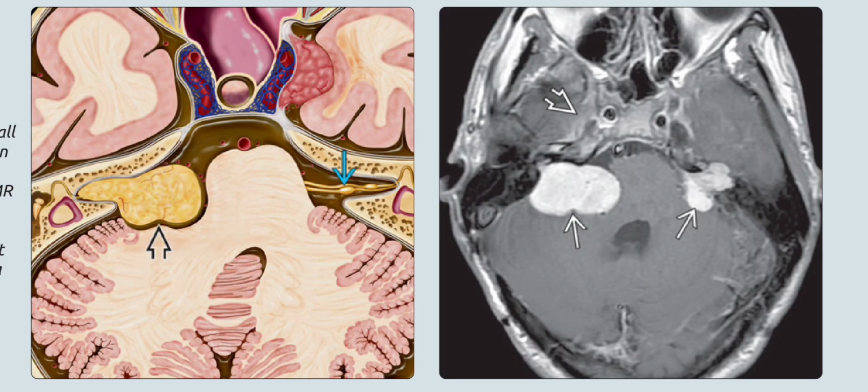So coming towards the neurofibromatosis type 2 cases, left is the axial graphic, and it shows the bilateral cerebellopontine angle schwannomas, which are pathognomonic of neurofibromatosis type 2. The tumor on the right is large, and several small schwannomas are also seen on the left vestibulocochlear nerves.